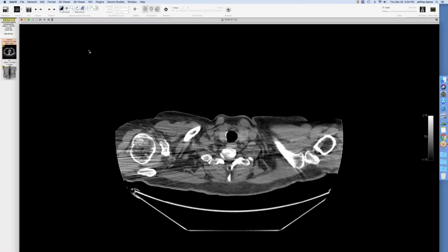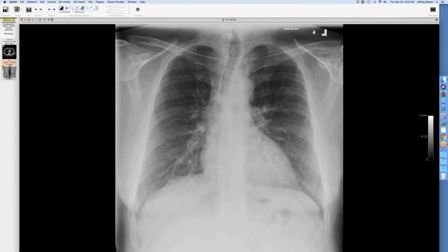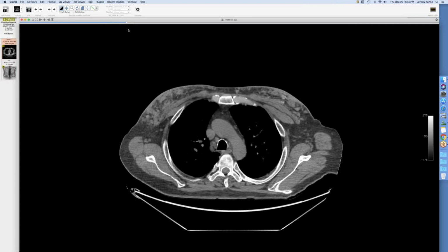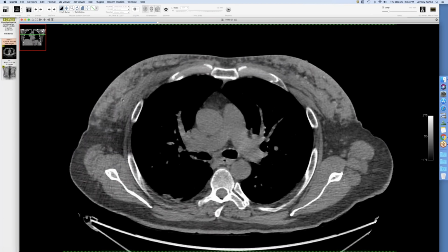This is a cool case that Chris Meyer shared with us. This is a transgender patient, so is now identifying as female, and you can see here's the radiograph. And the reason I'm showing the radiograph is this is an energy subtraction, dual energy. So these are the bone calcium images, and you can see there's this really dense material in the soft tissue of the breast. And that's from a year before, but I've got a CT now that shows this very amorphous thickening of these calcifications in the subcutaneous tissue.